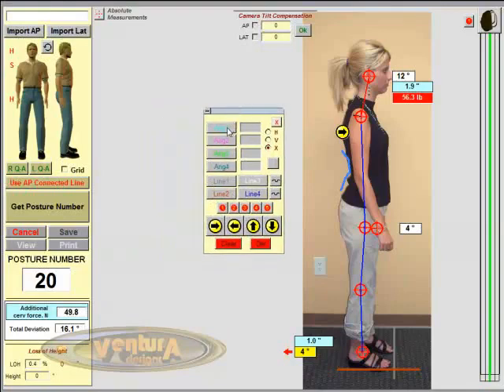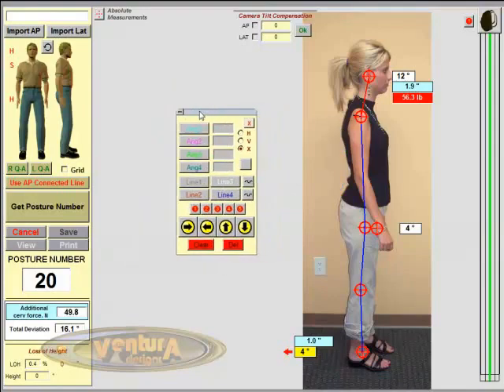Posture Pro also has 4 different angle generating tools that can be used to do other types of measurements, like range of motion. If you wanted to know the range of motion of the person's neck and were aware of how to do that, you could actually then track range of motion and see the progress in it as the sessions progress. Any other questions?